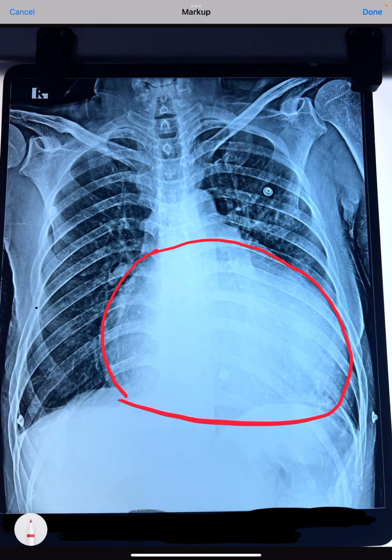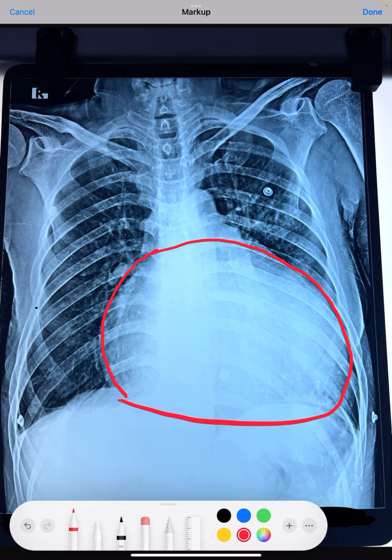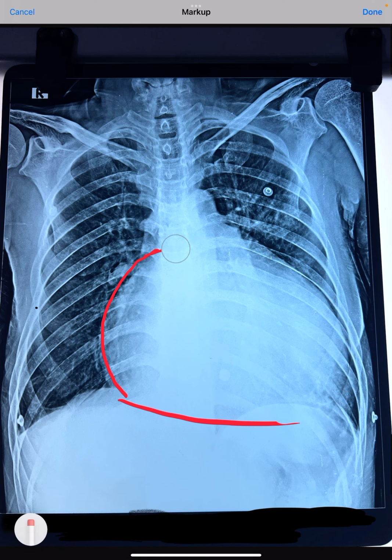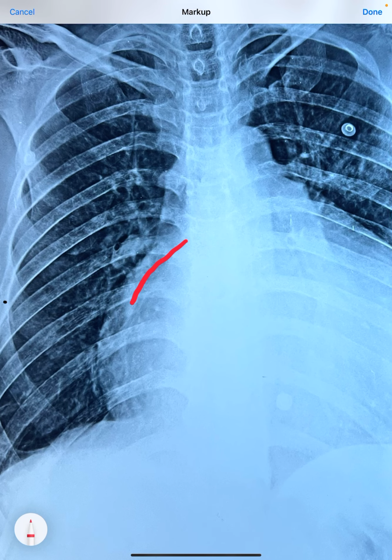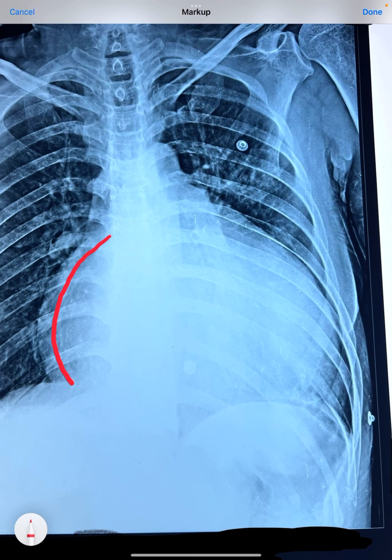Now, one of the most important things to understand in this case is how the borders or margins are. If you can see, the contour of this is perfectly globular, and the contour of this as well is also perfectly globular. So just think of any balloon which is not inflated. As soon as you inflate the balloon, it will be completely inflated and completely globular. This thing is happening here as well.